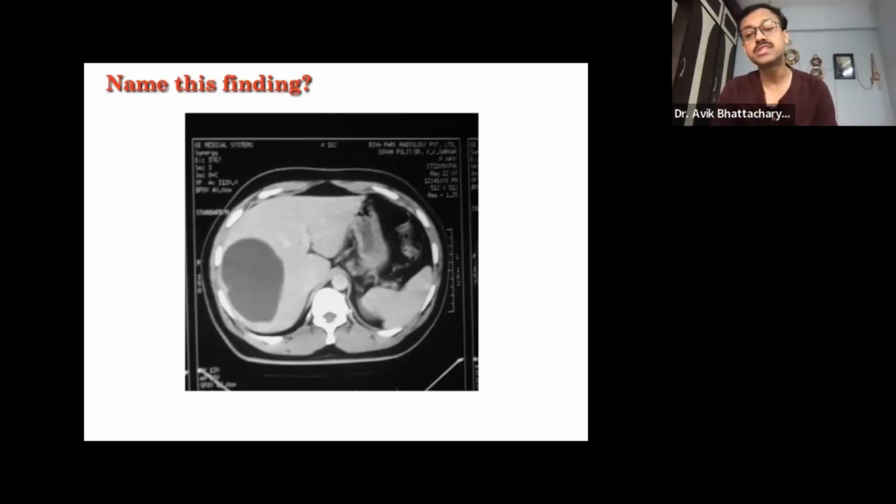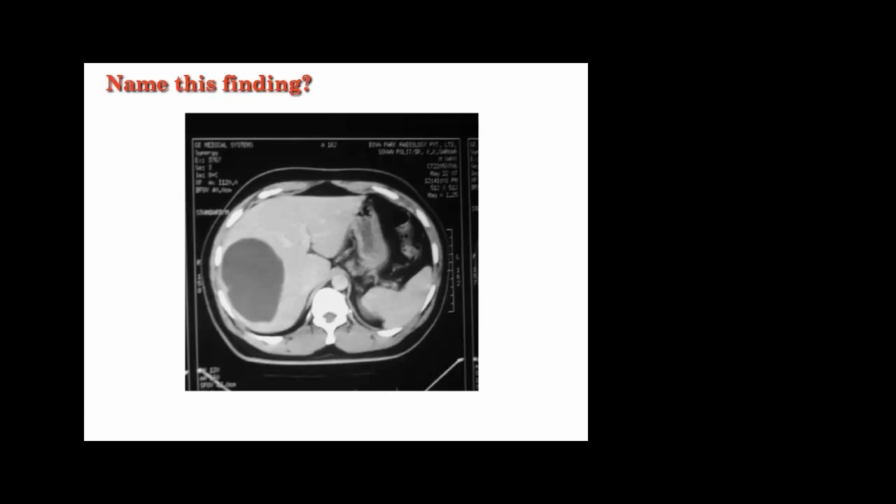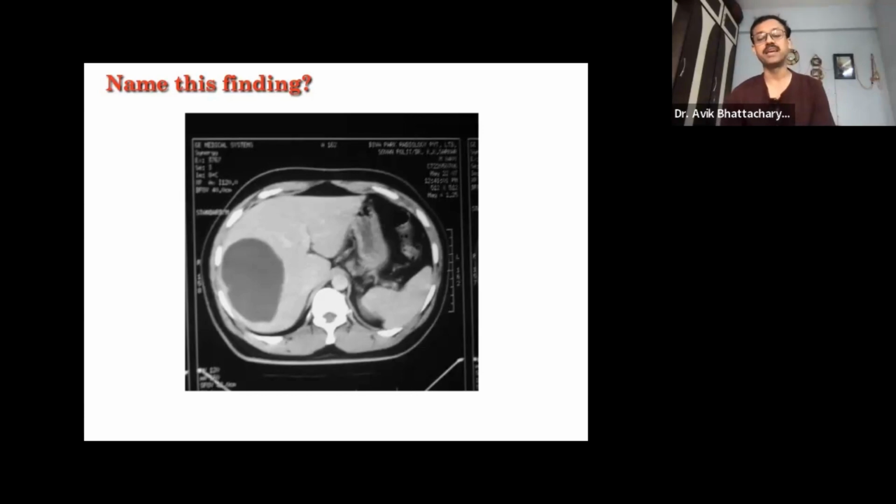And what is the name of this lesion? Cystic. It is a benign cyst, benign or simple hepatic cyst.